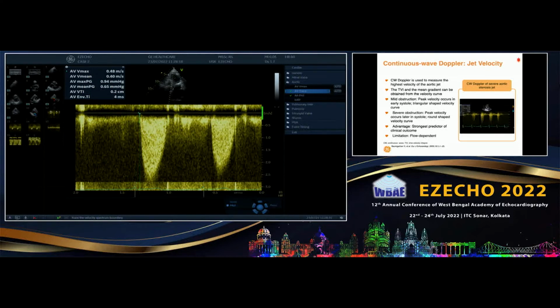Now if I get higher gradients because of increased flow across the aortic valve, because of, say, anemia, tachycardia, thyrotoxicosis, anything like that, then both the LVOT flow and the aortic flow will increase proportionally. So that ratio won't go down. Anything that starts going below 0.4, be careful. 0.35 is definitely significant. 0.3 is 100% significant, severe. And this is not aortic stenosis of that severity, that is nothing.